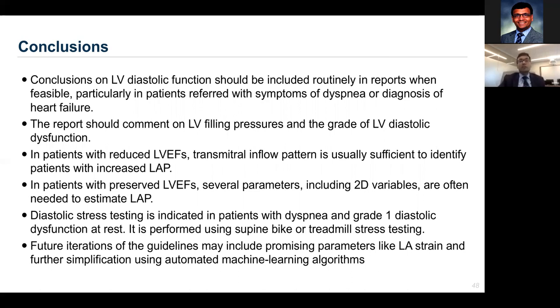In patients with reduced LV ejection fraction, transmitral inflow pattern is very good index of looking into the grading of diastolic dysfunction. And using a multiparametric approach we can come at fairly accurate assessment of left atrial filling pressure, particularly in patients who have myocardial disease or abnormal LV function.